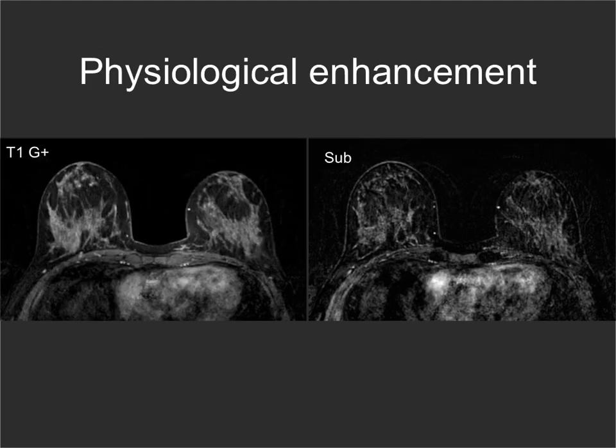So this is a patient who has very high background parenchymal enhancement. Don't forget that we judge background parenchymal enhancement compared to the amount of fibroglandular tissue. We're not looking at the enhancement of fatty tissue. So this patient has heterogeneously dense breasts, but has severe background parenchymal enhancement. And as I said, even though this particular patient was imaged at an optimal time of her cycle, she was only 35 years old, and MRI is going to be undoubtedly lower sensitivity in her.